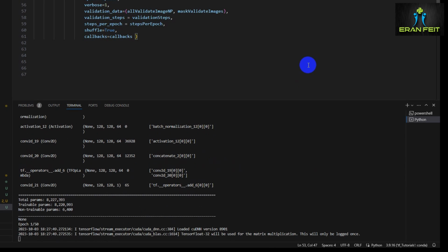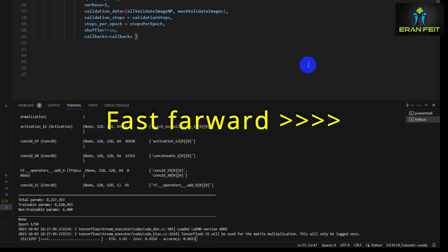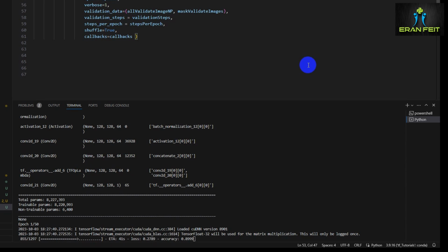As you can see, the training starts, 1 out of 50. This training process takes about 3 hours, so I'm not going to wait all that time, and we are going to jump directly to the last epoch. Let's wait a few more seconds. I will stop the video here and start from the last epoch.